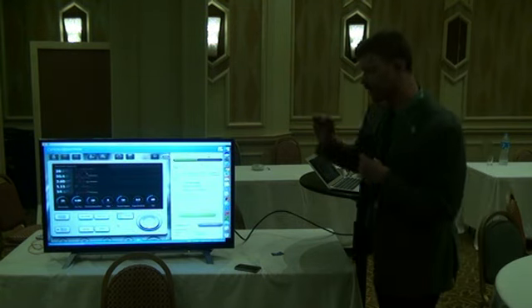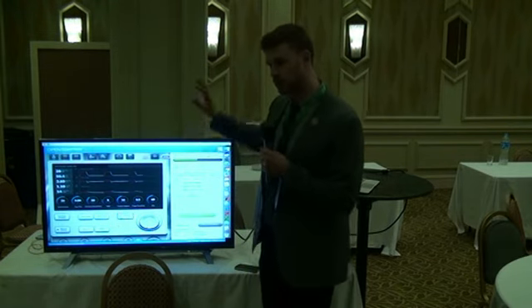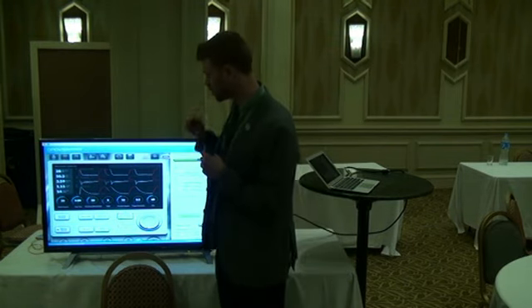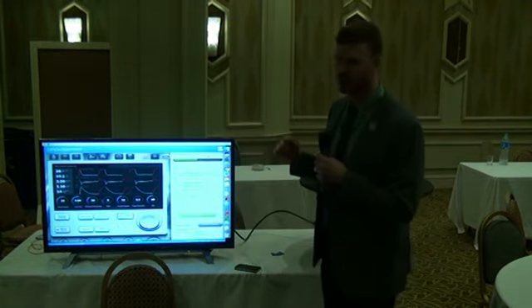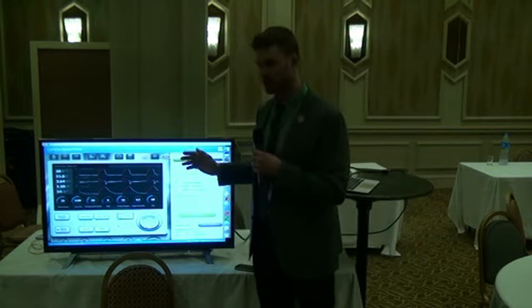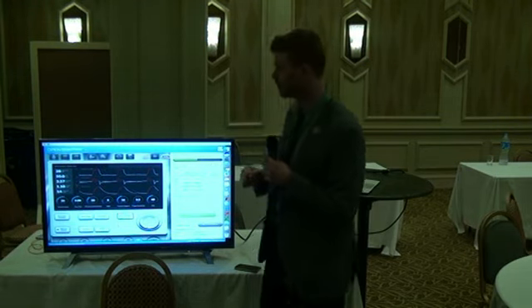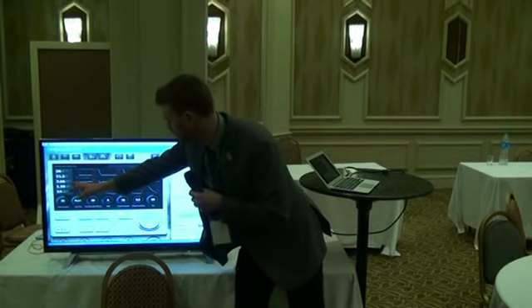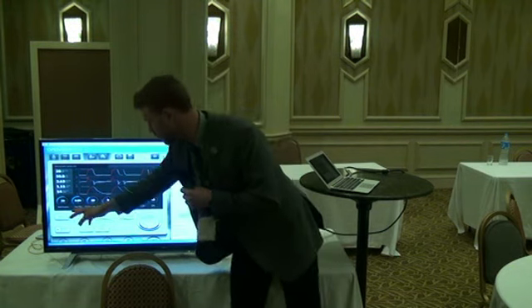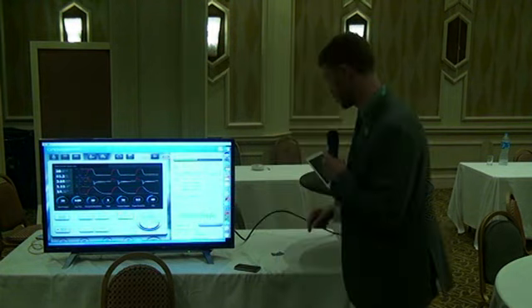So if we want to look at anything, just let me know. If we want to get a blood gas, we can do that. If we want to get a chest x-ray, we can do that. But we're going to step through the interpretation and mostly focus on the waveforms. So what's grabbing your attention? I'm trying to make this a little interactive. I'm going to pose to you what is interesting or out of place with the waveforms or any of the physiologic values. I should point out this is the tidal volume per kilo, and all the settings are down here. Right now she's on 28 of pressure over 8, a respiratory rate of 22, and 60% oxygen.